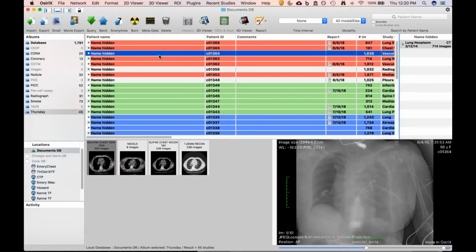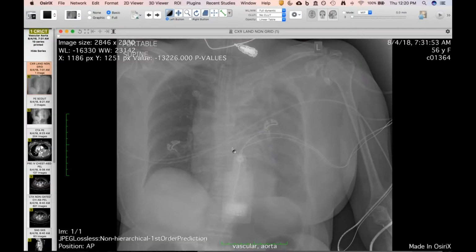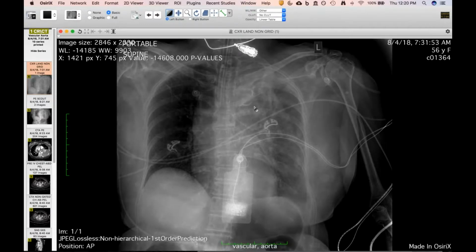I'm going to show this one just because we're on the aorta theme here and the radiograph theme. This is a patient who came in, you can see there's atherosclerotic calcification, and came in, arrested, is intubated, and this is the first chest radiograph. And I think in this case, we have other findings of some sort of mediastinal hematoma or aortic pathology.